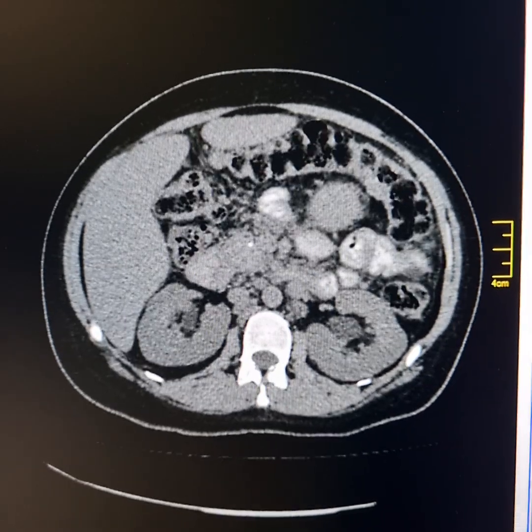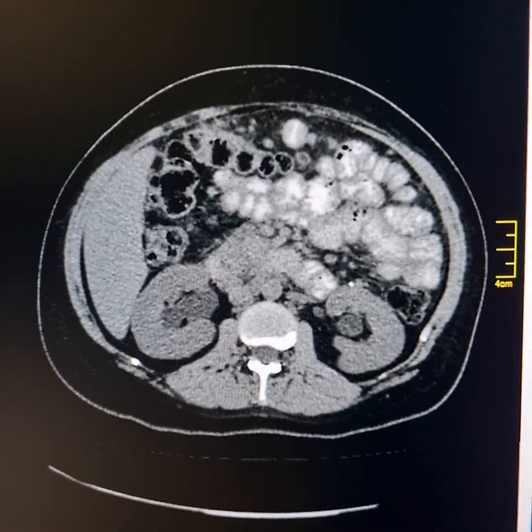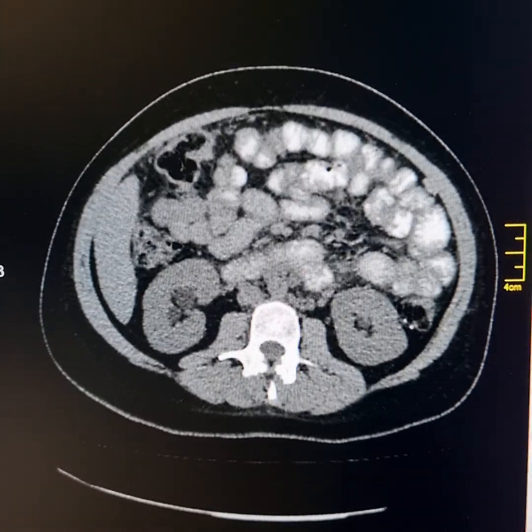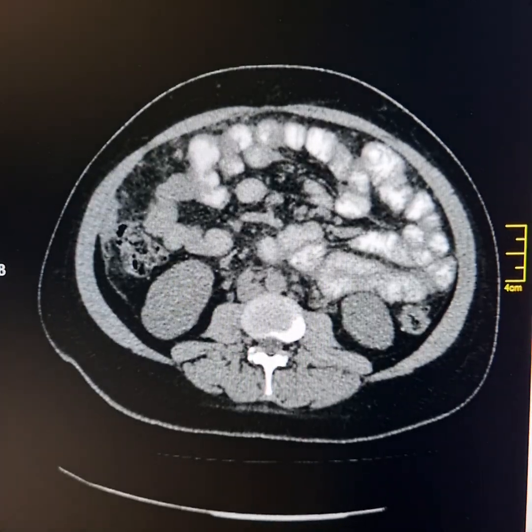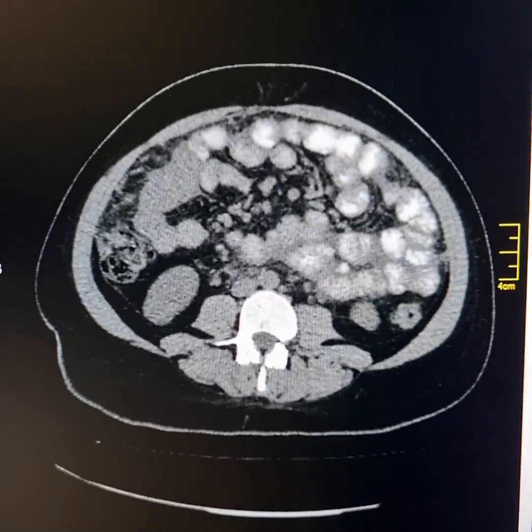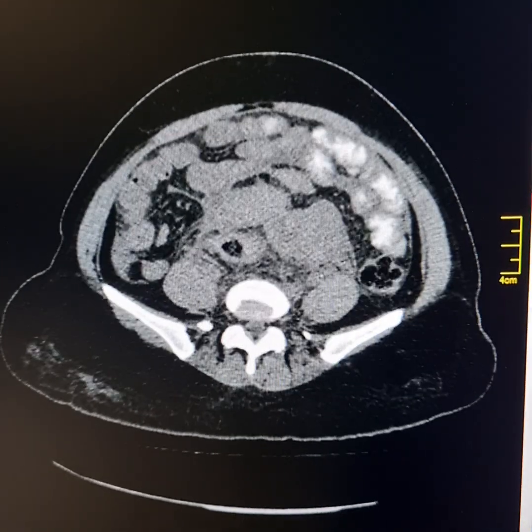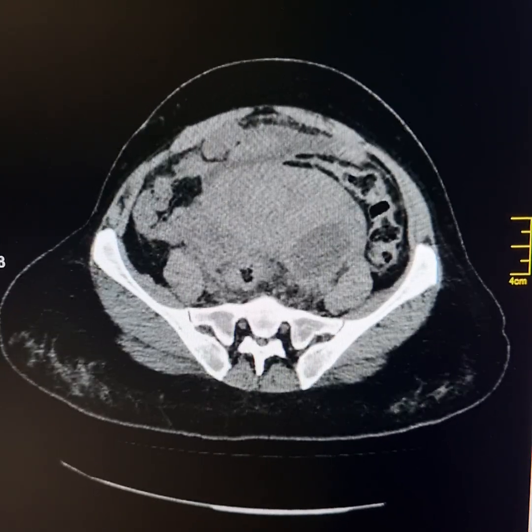This is a plain CT scan of a 29-year-old female patient. The patient previously had some surgical uterine intervention which she was not ready to disclose. There is mild hydroureteronephrosis on both sides. Lot of inflammation in the lower part of mesentery.